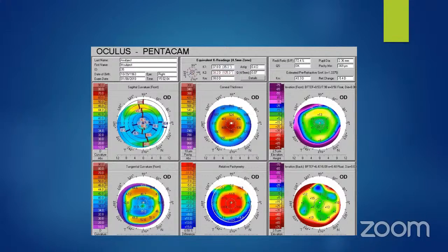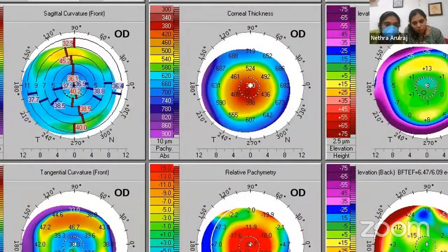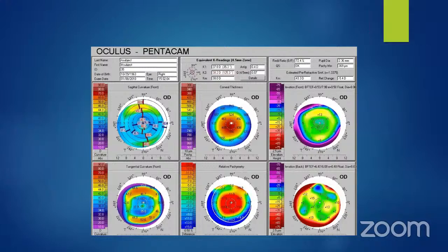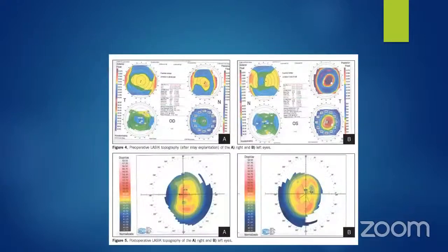Right. What are we looking at? Center is flat, right? Yes, ma'am. So post-LASIK. So basically this was a femto-LASIK, but that we can't make out from seeing the image. It's just that I picked up different patients, so I'm putting the label according to what it was. Okay.